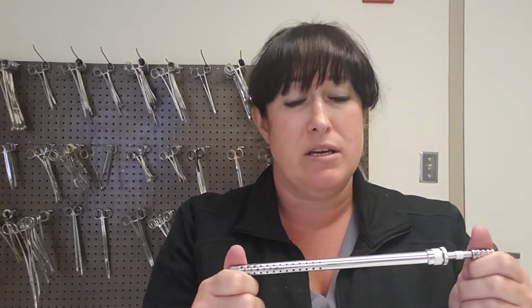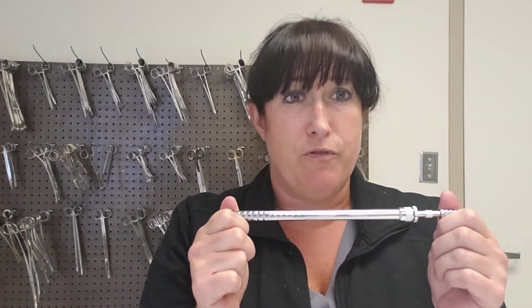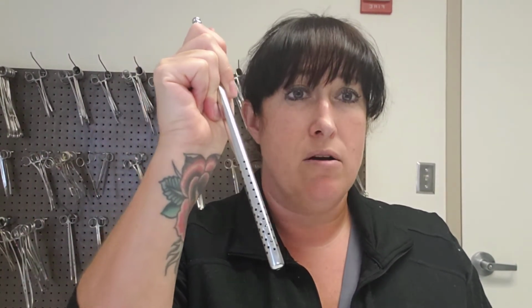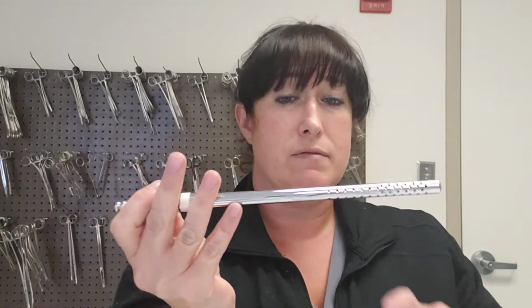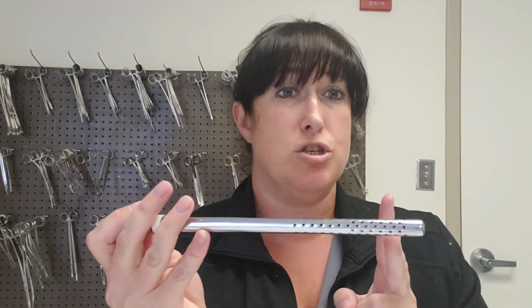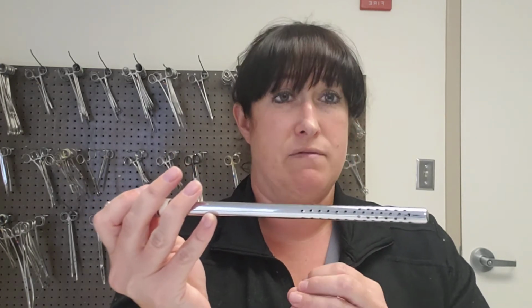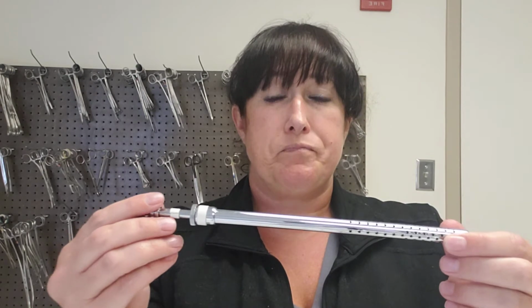And the doctor's not going to be able to see what they're doing if the abdomen is filled with blood. So the very first thing you should have ready in your hand while that surgeon is opening up that belly, because this is probably going to be an emergency, is this, ready to go, and start suctioning up as soon as fluid starts coming out. If needed, you can get 2 of these. You'll have to have 2 of these and then 2 suction tubings as well if you've got that much blood. In a trauma, go ahead and be prepared and have that stuff ready to go. But anyways, you can use these and suction up the blood.